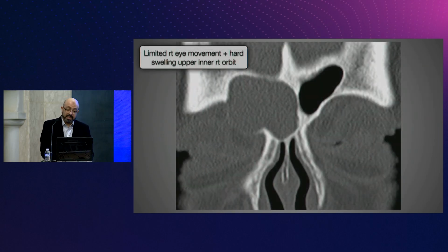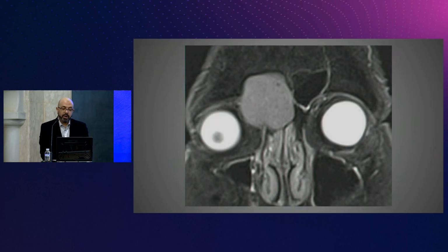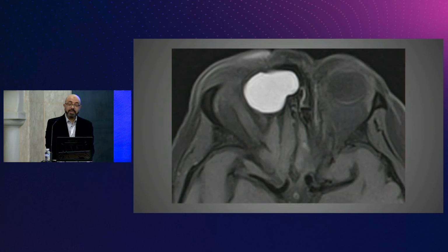The other extreme is expansion, which is way more common. So the frontal sinus is the most common sinus involved in a mucocele. And here, what could you see on this MR? So an expanded frontal sinus, the wall is intact, right? CT can be deceiving, but the MR will tell you whether or not the wall is intact. High on T2, and this is T1 without contrast. Because of the thick proteinaceous contents, sometimes you can get high T1 signal.